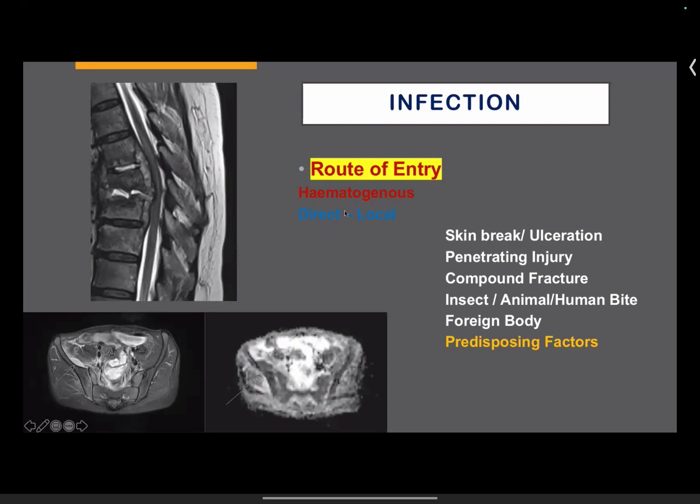But we have an increasing number of patients now who have comorbidities. They can have UTIs, or they can have acute cholecystitis, things like that. And then during that state, they can have bacteremia, and bacteremia can cause septic arthritis, spondylodiscitis, or in this young child, as you can see, there is this iliacus abscess from septic arthritis of the sacroiliac joint.